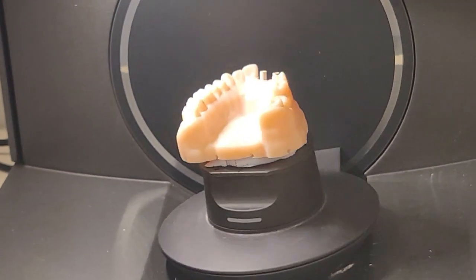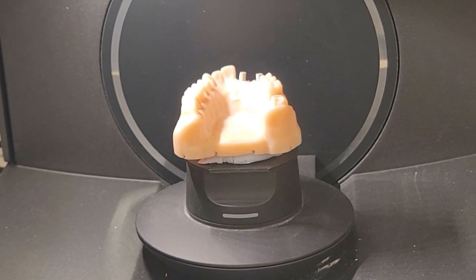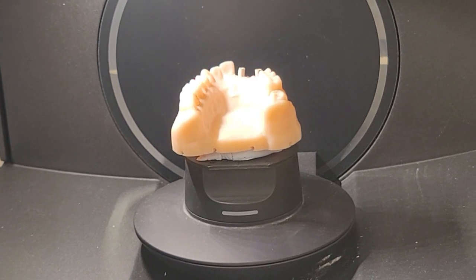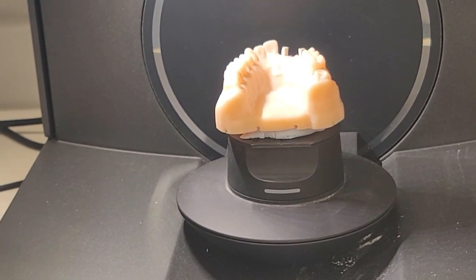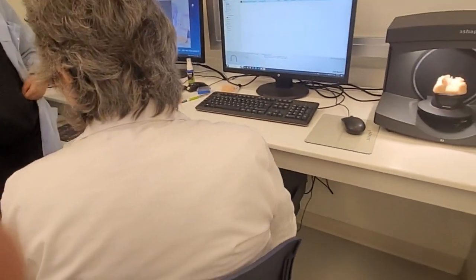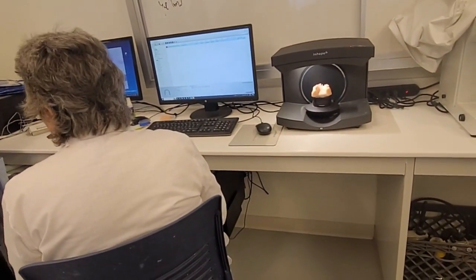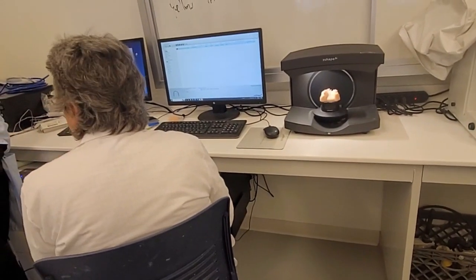It depends on the computer that you use. It could be a little faster or a little slower. So because our computer is a little bit older and not so powerful, it's going to take a little bit of time. In general, you want a graphic computer that can hold a lot of data with the graphics, exactly what we're doing now. So if you do this every day, you want to invest in a more powerful computer, like a gaming computer.